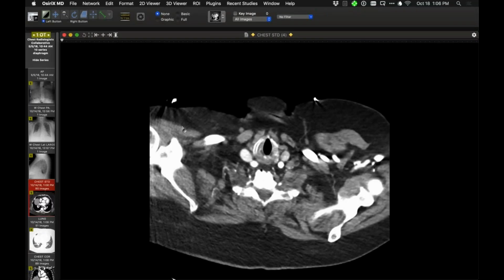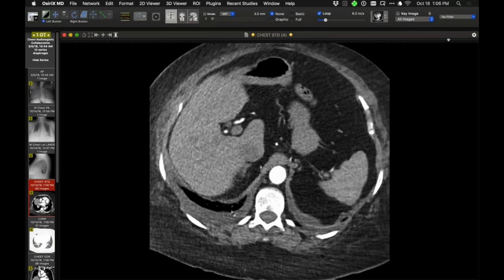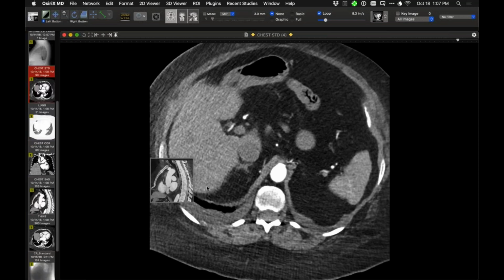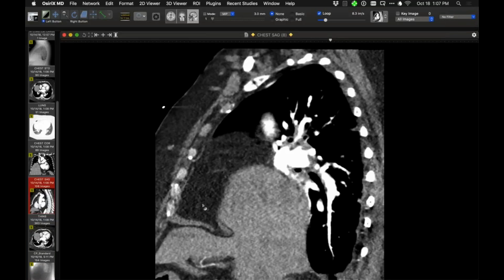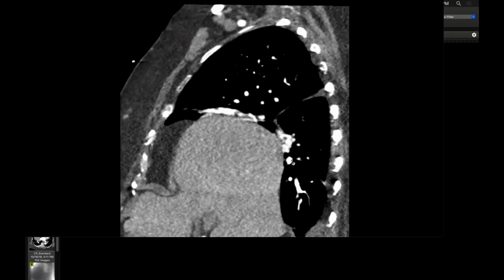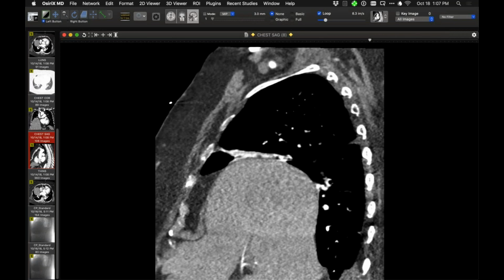So when we go to the CT and we look at the diaphragm, we'll see that particularly in relation to the posterior diaphragm and the right crus, there is no atrophy of the muscle. And if I scroll through the sagittal projection, we can see that the anterior diaphragm has normal muscle thickness as well in this portion, until the diaphragm is buckled upwards by the liver. So this portion, by inference, is thinned, but this portion isn't, nor is the posterior. So they were still concerned about hemidiaphragm paralysis.